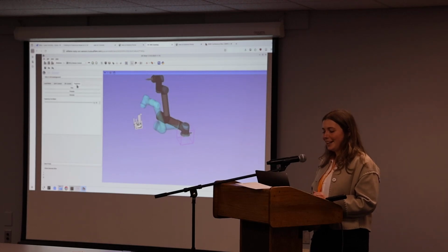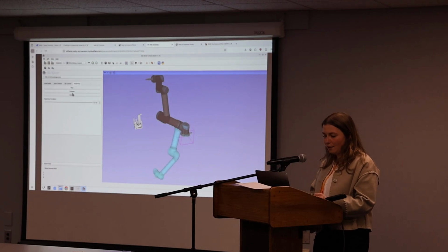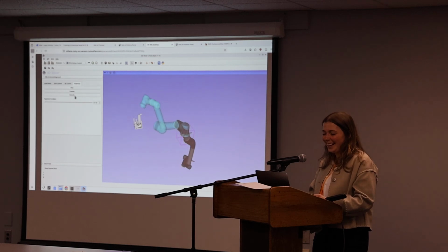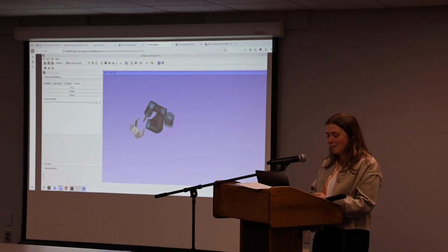But basically, if you do this, you can plan a trajectory. Here we'll see the actual stylus on the real robot. Again, crazy trajectory. And then we can execute it. This would kill a patient, I'm sure. I don't want to be treated by this robot. And I don't know if it's actually on the robot.